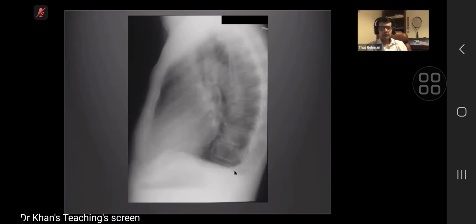On the lateral radiograph, there will be a flat hemidiaphragm and a sharp dip in the case of subpulmonic effusion. Some fluid is going up the major fissure as well. So you can do a CT or an ultrasound to diagnose it easily.